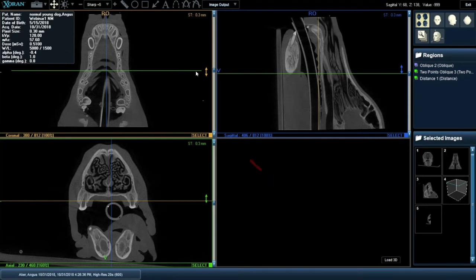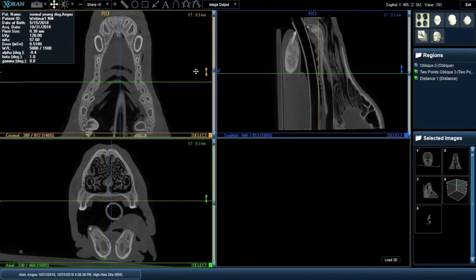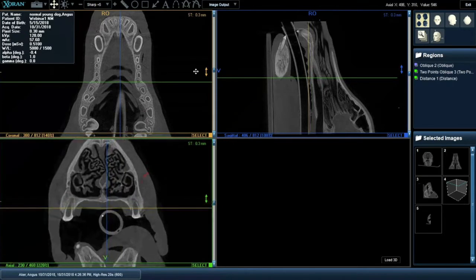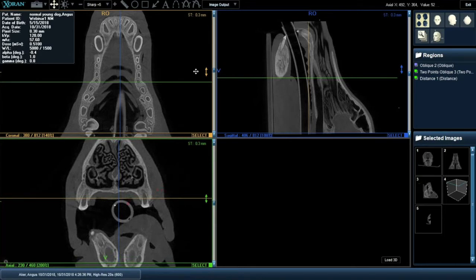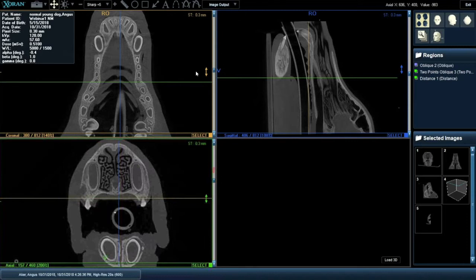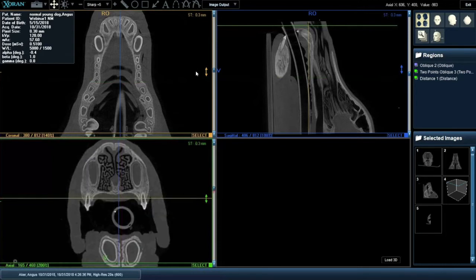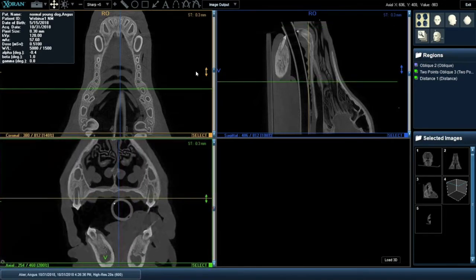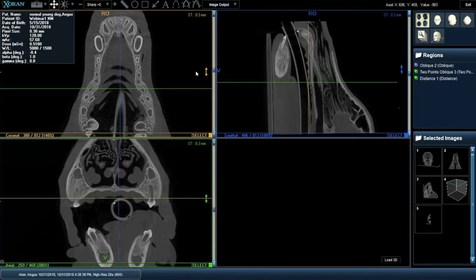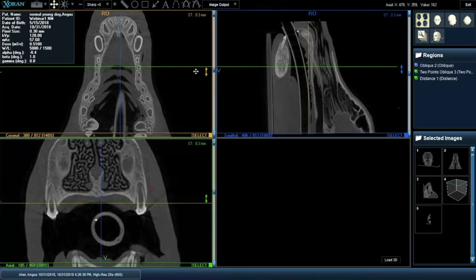We're looking at normal anatomy on the young patients. This is exactly the way this anatomy would present itself as you are first scanning the patient. You can then zoom in and look at this more closely. A lot of times people will ask me, how do you first look at it? I like to look at the axial view first and scroll through the anatomy from the nose to the caudal aspect of the patient, just to get a rough sense of the anatomy. But here I just want to stop at a couple spots and show you what to expect when the anatomy is normal. And so if we scroll through, we'll see a couple different situations.